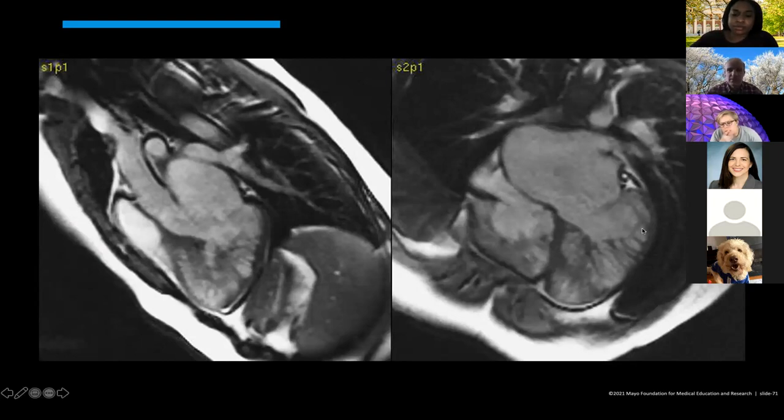As you look closely at the left ventricle in particular, you also see it in the right ventricle, but mostly in the left, very, very trabeculated myocardium. Has a fishnet appearance to it. Very little compact myocardium. This is left ventricular non-compaction.